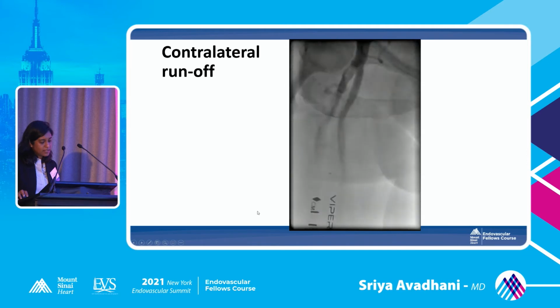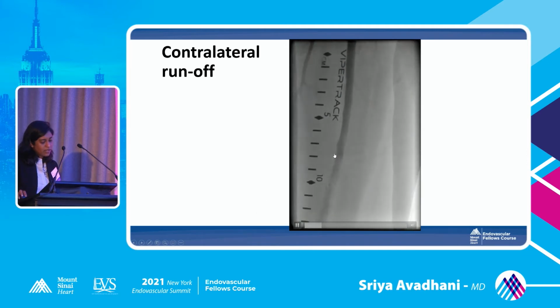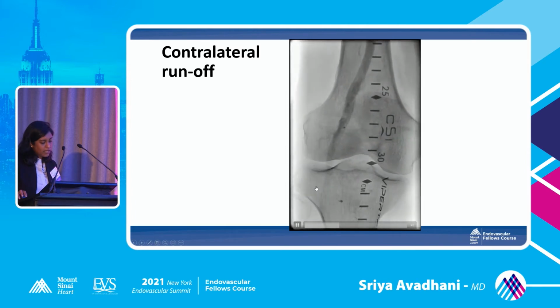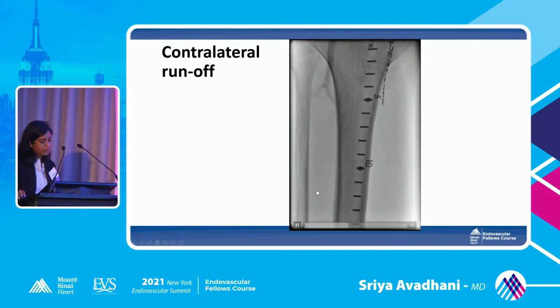And this is the right-sided runoff. Again, pretty good, very minimal disease in the SFA and POP, and good three-vessel runoff on this side.